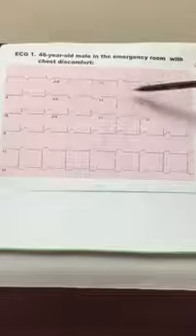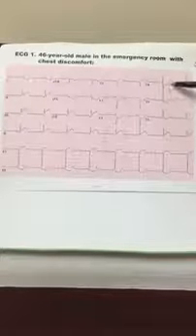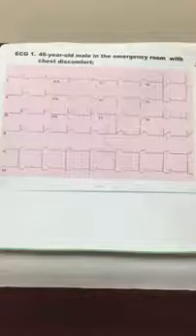And so in this case, when you're looking at the ST segments, I notice right here in 2, 3, and AVF, there's elevation of the ST segments there. And also a little bit of elevation in V1. And we have then depression in V2, V3, V4. Yeah, V2, 3, and 4, we have some slight depression. And also in lead 1.